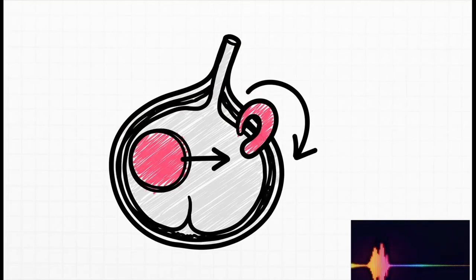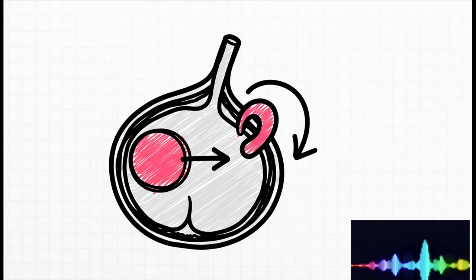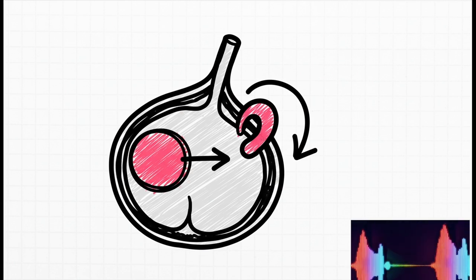Now, here's a fantastic little diagnostic tip. Sometimes before you can even clearly see a mass inside the gland, the pituitary stalk will give it away. A deviated stalk is a huge, huge clue. Think about it. A mass is going to push the stalk away from it. So if you see the stalk pushed over to the right, you better be squinting really hard at the left side of the gland for a hidden lesion.